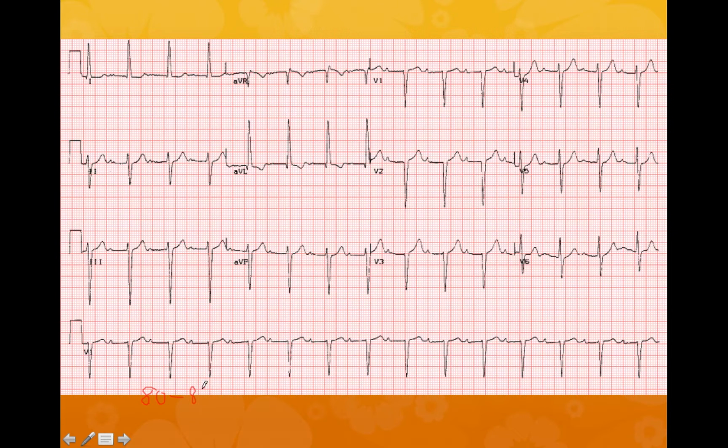Next, we're going to be looking at the P waves. We can see a P wave there, P wave there. This is V1, where we're typically going to see upright P waves, V1 and lead 2. Again, lead 2 has upright P waves. And so the P waves look to be in quite an abnormal position. They're pretty far away from the QRS complexes.